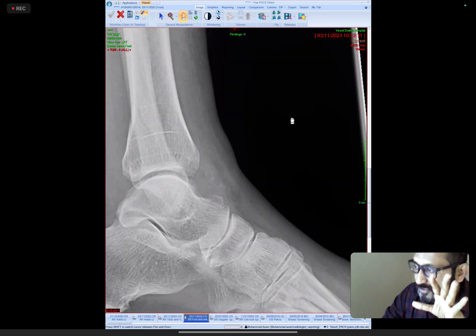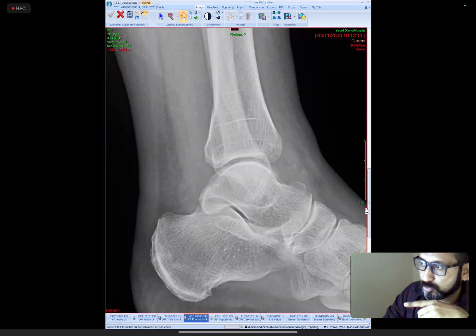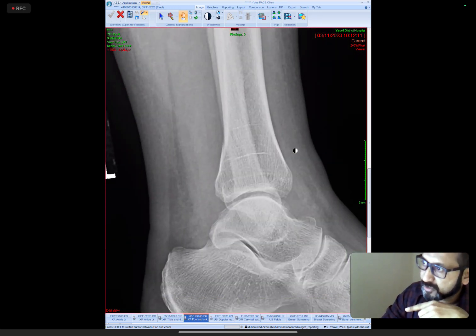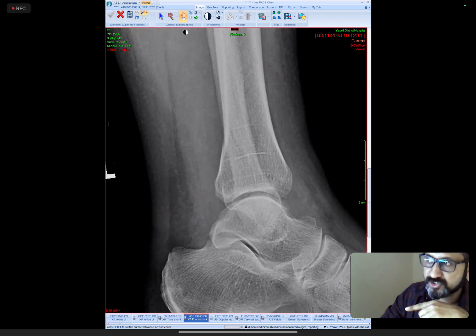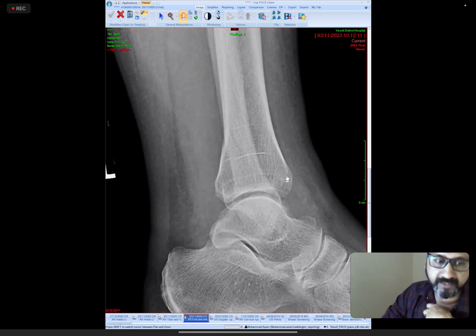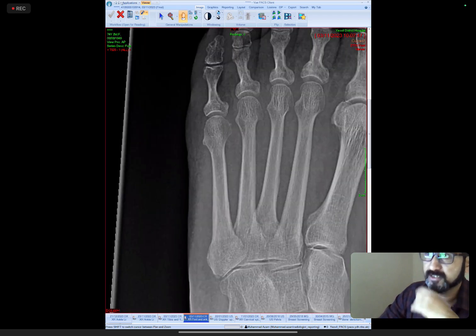And then see each and every bone. If you would like to change the gain, you could change the gain as well. This is the third step. This is my practice, which I was doing in my rapid reporting practice.